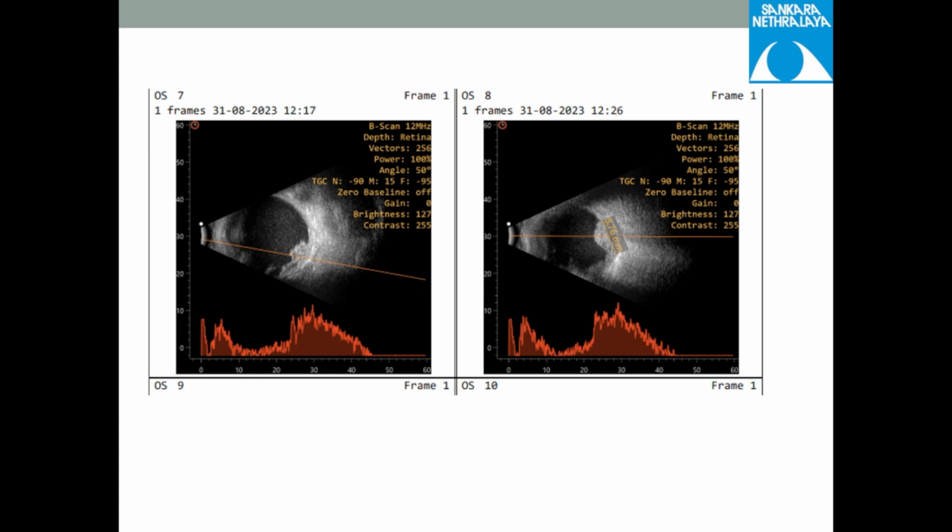So normal choroidal tissue is bounded by two hyperreflective membranes, and in between it's not very low reflective. It's pretty high reflective because it's got vascular tissue within it. So there'll be a lot of reflectivity. It's almost like a choroidal hemangioma without a mass.